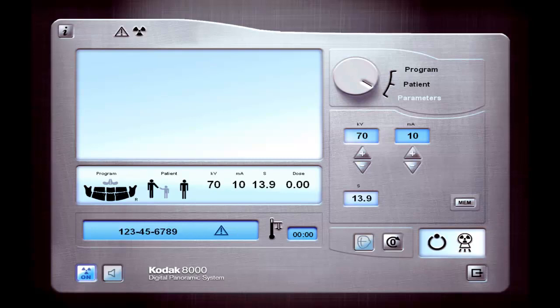If you come over to this icon button right here, which is the movement reset, click on that, the Pano machine will start to rotate back to its home position, and you will then notice that this ring here will go to green, and we are back in position, and a green ready light indicates that it is ready to go.